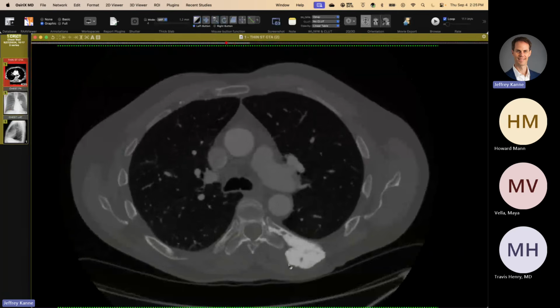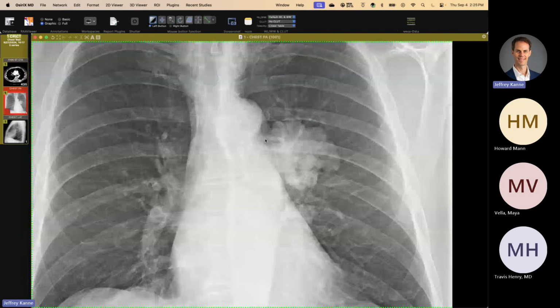So it's a benign lesion, but it's kind of a fun radiograph, because if you don't have the lateral, you might think it's a hilar mass or something, but looking carefully, you can maybe see the vessels going between it there. So I haven't seen one this big before. And your differential, of course, is a chondrosarcoma, but this one was not, and it's been stable for a long period of time. So kind of a cute radiograph.